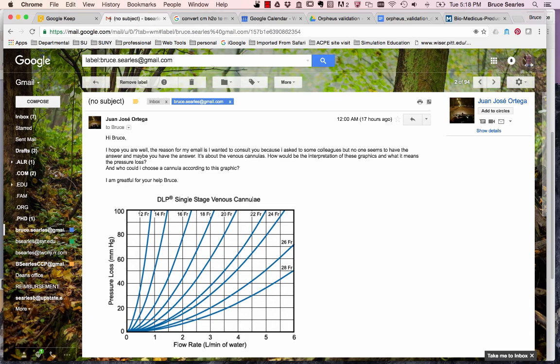Thanks for contacting me. I had a great time visiting you in Colombia, and I'm really happy that you reached out to me with this question about how to choose a venous cannula. This is something that I don't think is published anywhere, and a lot of perfusionists have had to figure it out for themselves. I'm happy to help. Let's look at the graph.